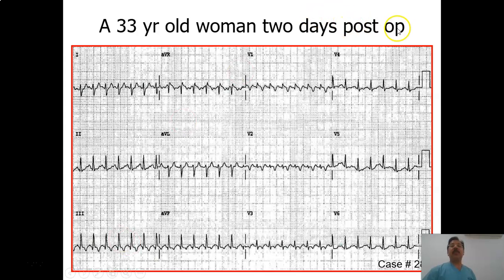But as the patient is post-operative, so probably sinus tachycardia. Axis, lead 1 and AVF, there is a right axis deviation. Lead 1 is negative, AVF is positive. Atrial hypertrophy, look at lead 2. The P wave is quite big as far as the ECG size is concerned.